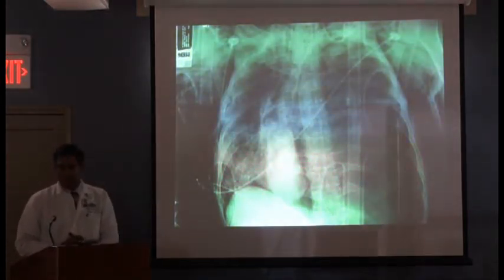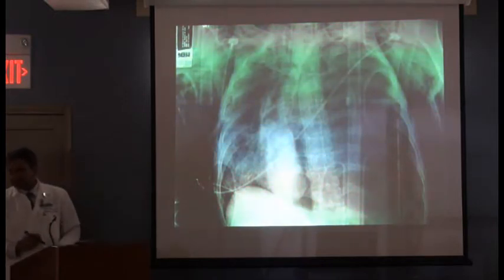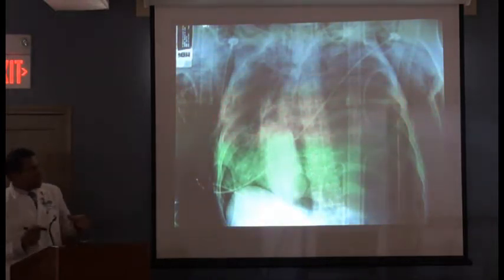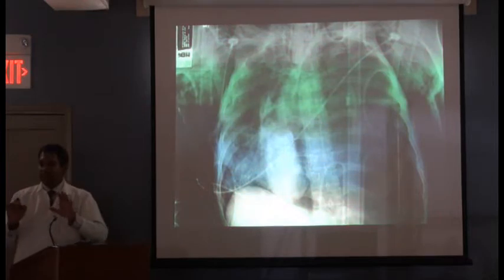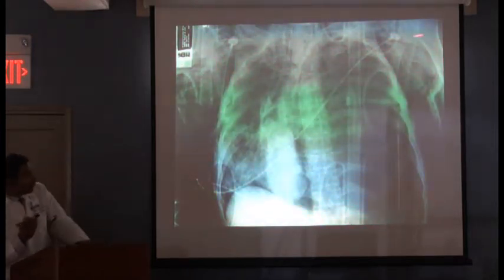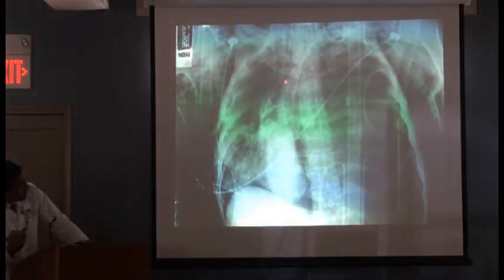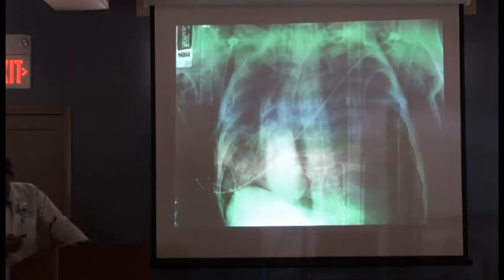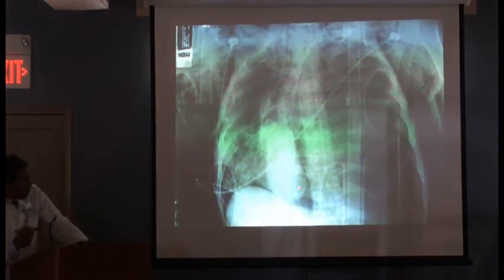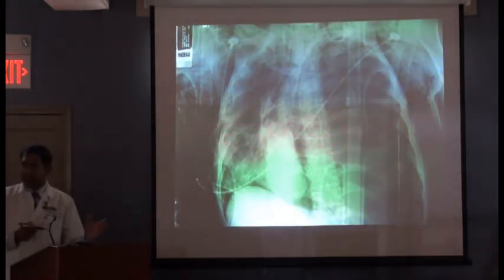Okay. Who said whoa? All right, Gina, what's going on here? Just go ABCs. Again, anytime you see a chest X-ray, just take a step back and say ABCs. So let's talk about airway. Where's the airway? It's totally pushed over, right? See the airway right here? Totally pushed over. The bones are going to be okay here. What about the B, the breathing? This looks not black. This looks really black. All right, what's going on over here? This is the tension pneumothorax.